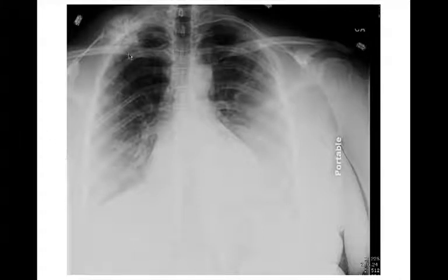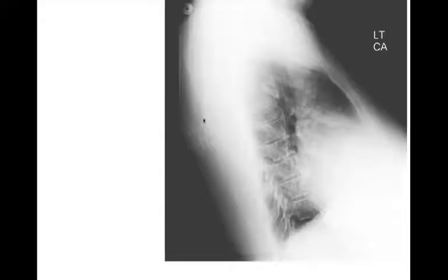So we have this, and this is kind of a corner shot, but if you look over here, the humerus is abnormal. This is this abnormal contour right here. It did go on to further imaging. Here's the lateral view showing you this calcified mass, which looks like a stalk, pedunculated, rising from the scapula.